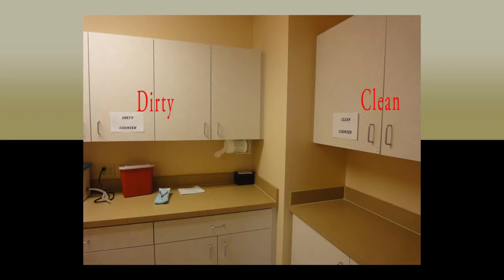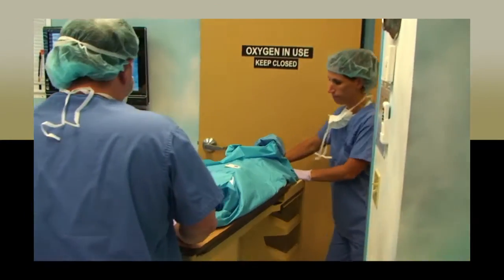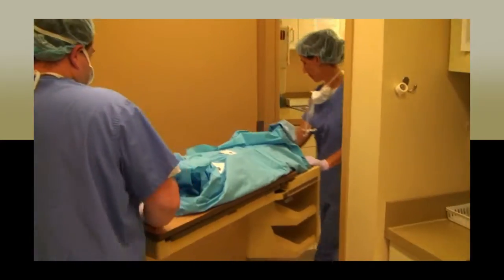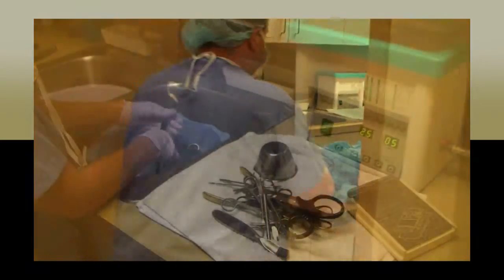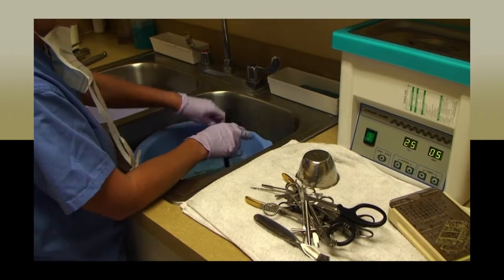You must enter the dirty room through the nurse's station on the dirty side. When a surgical procedure is complete, instruments are transported safely out of the front door into the dirty counter of the nurse's station, where they will be soaked, scrubbed, and rinsed. They are then to be placed on the clean counter to be packaged and prepared for sterilization.